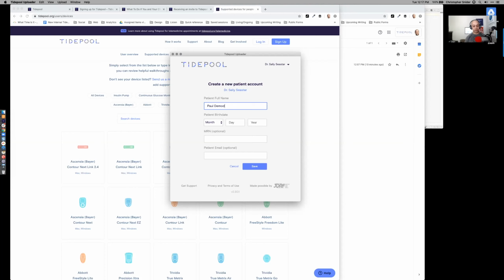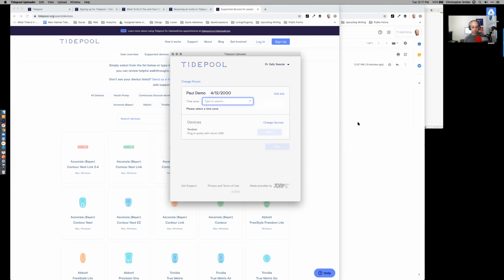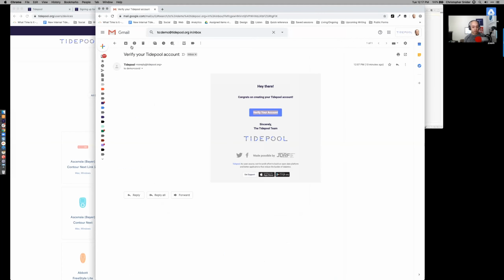We're going to create a quick account right now as a clinician. I'm going to show you what happens when a clinician is creating an account for you and they include the email address for your account. Let me show you what the email is going to look like for you real quick.